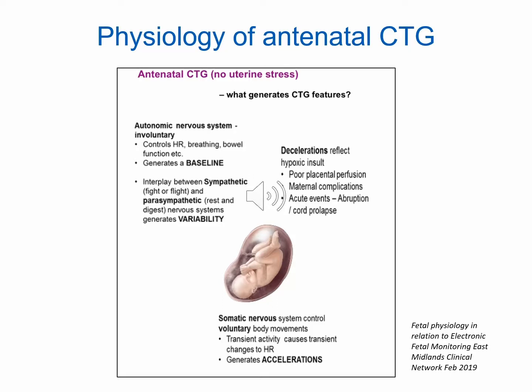Reduced variability can be associated with medications, antenatal brain injury, and hypoxia, leading to anaerobic metabolism and acidosis, which affects the central nervous system. This is suggestive of decompensation in a fetus, and hence reduced variability in the absence of a cycling pattern, and accelerations can be suggestive of decompensation and needs to be acted upon.